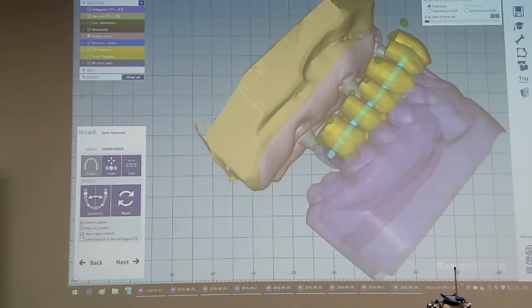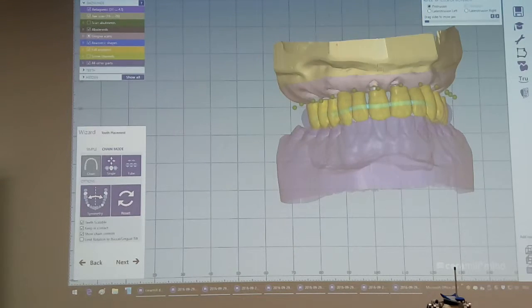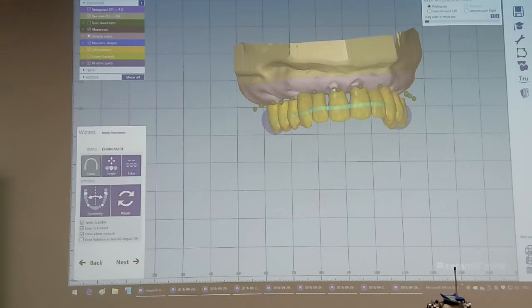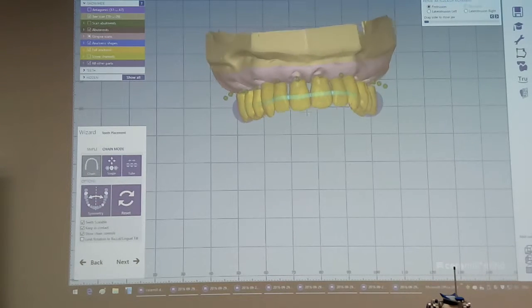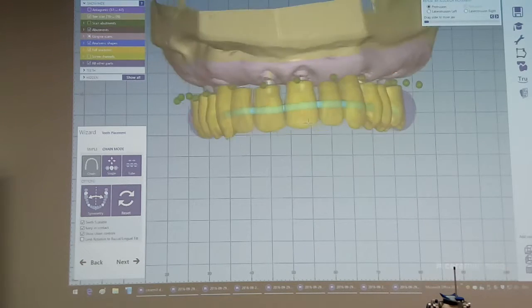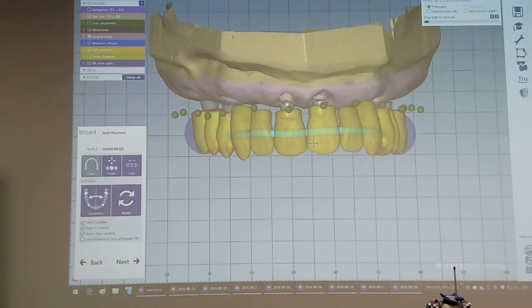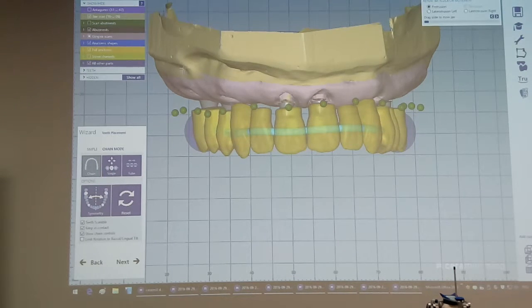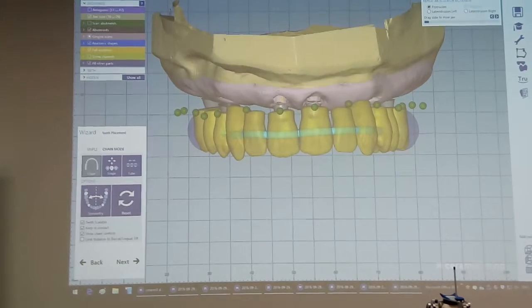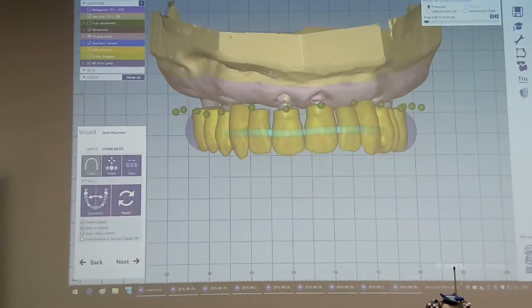So, this is the chain mode. Just an example of what makes sense to do here. This is my first good position of the front, and I will move the teeth for the model situation onto a fine position, maybe 1 second, like this.